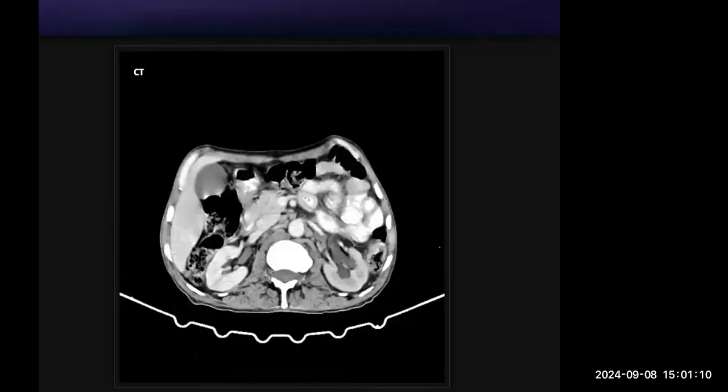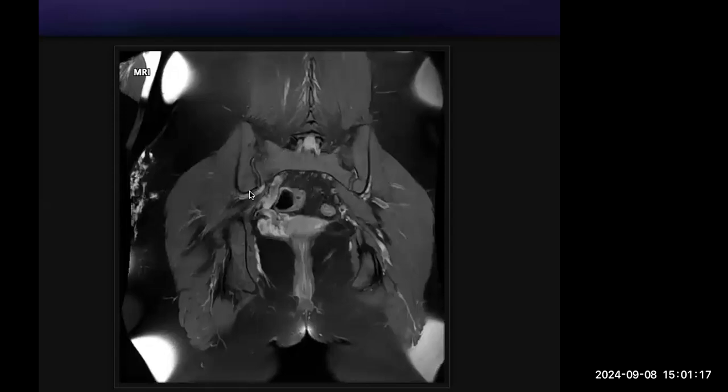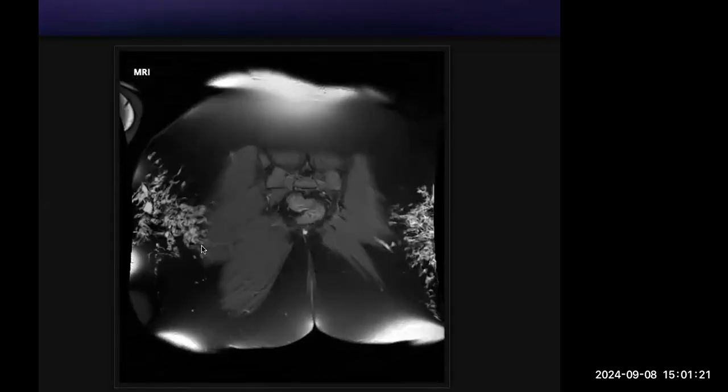Then I think I showed you this case. This was a patient who had multiple silicone injections for gluteal enhancement. So what happens in the long term? Sometimes these silicones can disintegrate, and then they can enter the bloodstream and cause embolism, or they can cause cellulitis or granulomas. So probably in this case also, the patient might have developed a granuloma and associated pain.